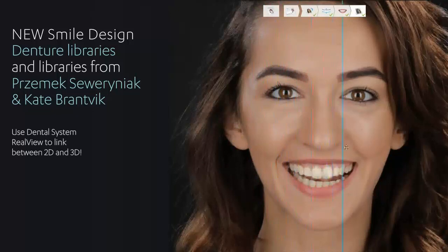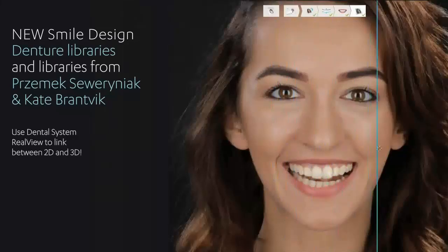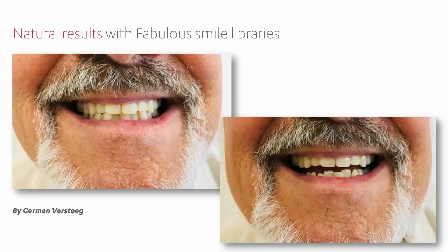I'm just going to play a small video here. Smile Design is basically taking a 2D image, and within 3 to 5 minutes, you can design it for the patient, and you can show before and after for the patient. And of course, every denture can use this, and people, for instance, like Esther, who asked a question before, are using it for their patients, with great excitement and great engagement.